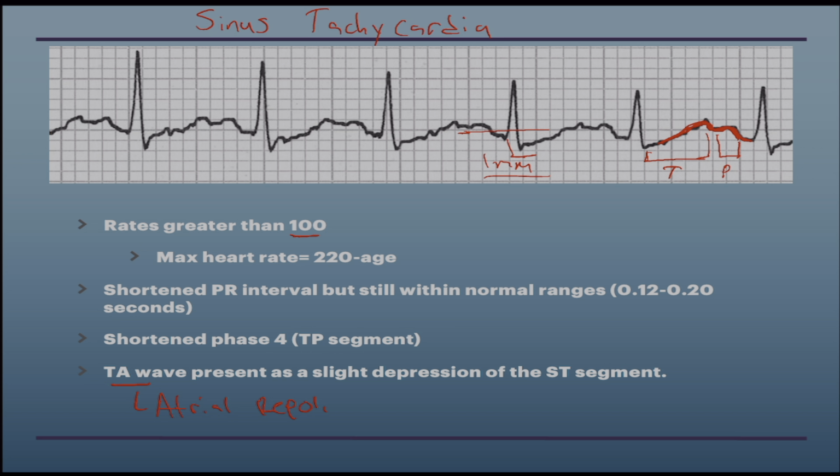But if I was to ask myself the questions that I need to ask to determine a rhythm, is it fast? It absolutely is. 300, 150. So we're at about 160 beats per minute.